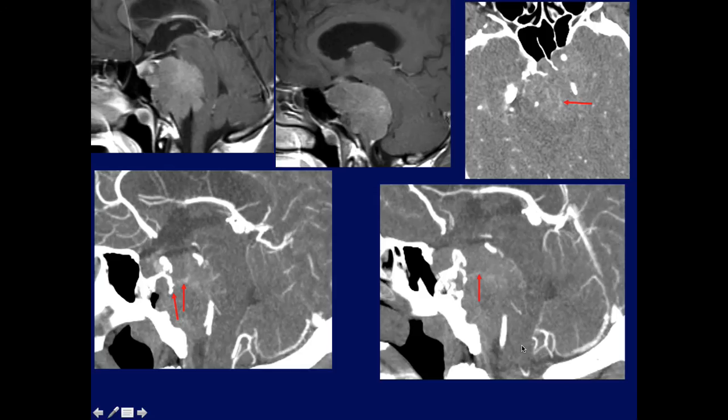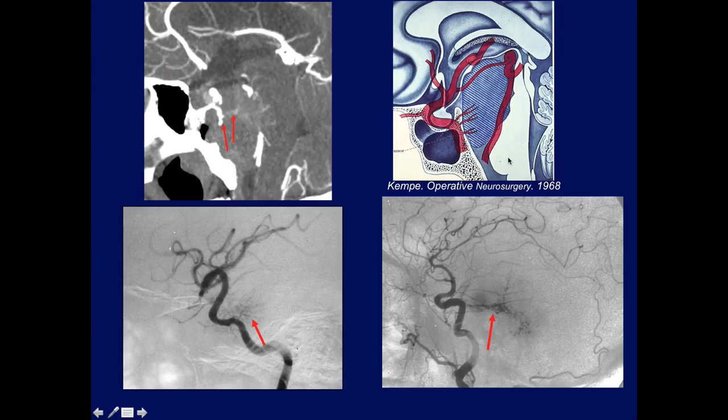How can we confirm that this is definitely a meningioma? We get to my favorite blood vessels, which we can see here. And remember, I've pointed these out repeatedly with olfactory groove meningioma, with convexity meningiomas, and also with other involvement. And here's what we have. These are these perforating branches coming off the internal carotid artery.